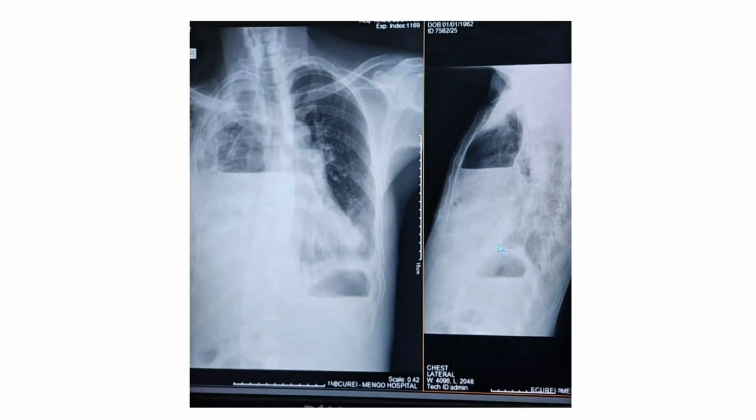When you look at this chest radiograph, a few things to note first is that line. So we have that line and air-fluid level, and we have ill definition of those ribs, and this image was cut off, but where we got it from, there was a bit of subcutaneous emphysema.